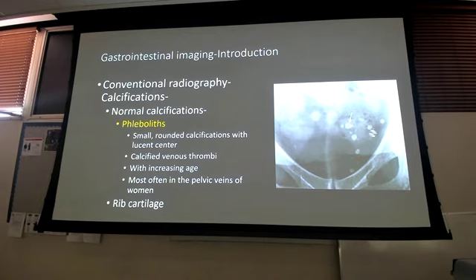And the reason we know they're phleboliths and not stones is there isn't any kidney stone or ureteral stone that size that's going to make its way into the bladder. That is big, right? If you were to actually measure that on the CT, it's going to be larger than the stone. Do you know what the stone size is that can pass through a ureter? Less than 5 millimeters, right? 5 is kind of the question mark. That's kind of the cutoff.